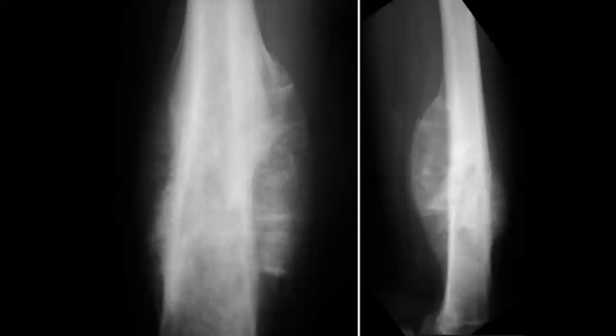Let's take another case which has this appearance. So we will go to our scheme. Is it a bone? Is it soft tissue? Is it a joint? So it appears like a bone lesion, right? If it is a bone lesion, you will have 5 points you should comment on.